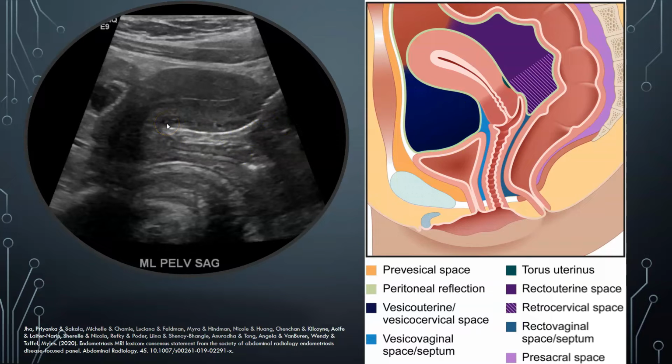And in patients with cardiac disease, kidney disease, liver disease, if they accumulate a lot of ascites, you'll see pretty much fluid all around the uterus. And we'll be going over that later, as one of the signs does pertain to that.